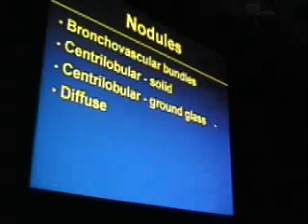Okay. All right, we'll move on to the pattern of nodular opacities. The predominant abnormality in this case are nodules, as you can see here. Notice that these nodules are not randomly distributed, but they are ramifying along that central connective tissue compartment, as you see here and here, ramifying throughout the lung. Notice that in this case we have some distributed along the fissure as well.